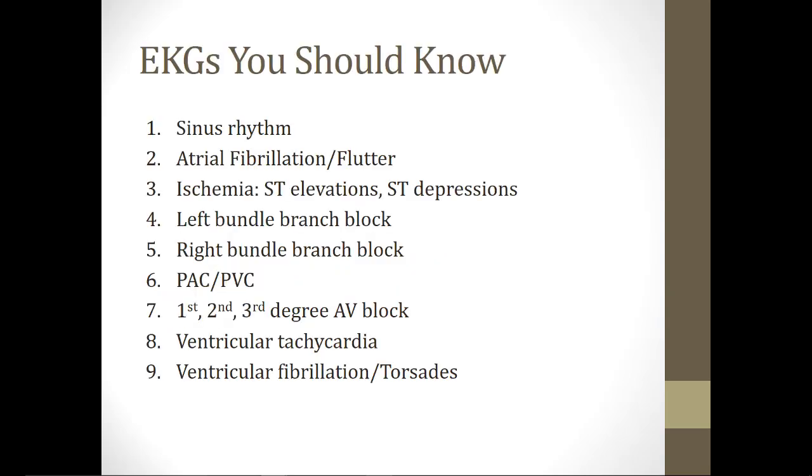It can be very difficult to learn EKGs as a medical student, and one of the reasons is because there are so many potential findings. What I've shown on the screen are 9 EKGs that I think medical students should be familiar with. These are the type of EKGs that may come up on the Step 1 exam. They're also the type that you may be shown as a third-year student on rotations and you ought to be able to recognize.